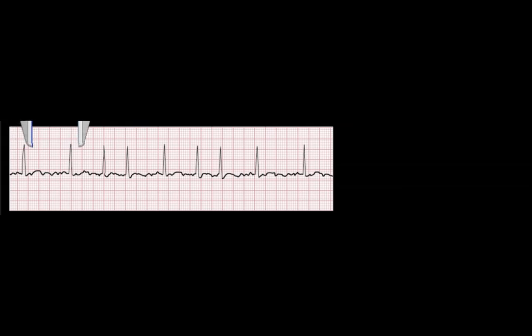Calipers are going to tell you that, right? You can see that there's really nothing that is lining up here, okay? And that's okay. This is telling us that this is irregular. There is no match whatsoever. Oh, there's a couple, right? That's about it. That's the only time that we saw anything that was regular.